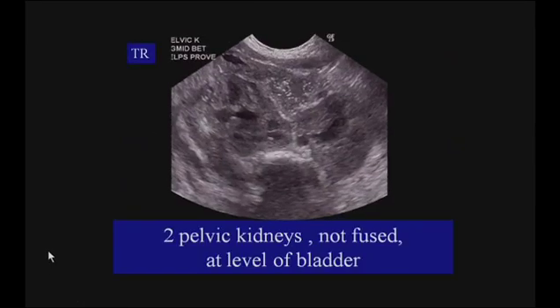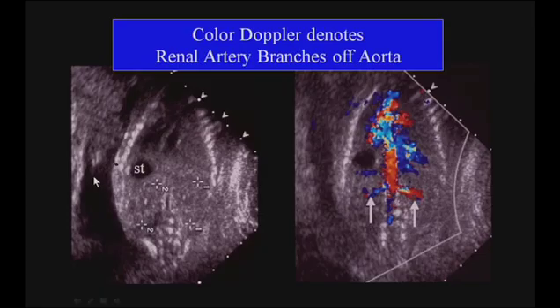This is a case in which kidney and kidney are seen on both sides of the vertebral column, the vertebral body. It's possible that this could have been one fused kidney, as in a horseshoe kidney, but this wasn't. And we saw bowel between the two areas of kidney, proving that it was just bilateral ectopic kidneys.